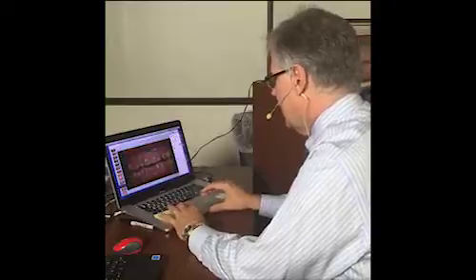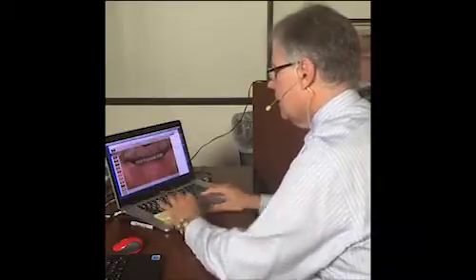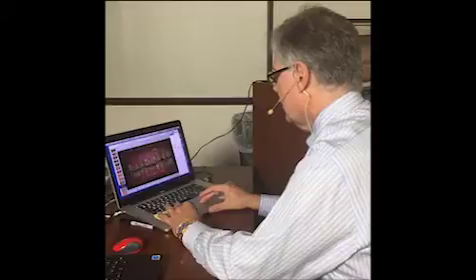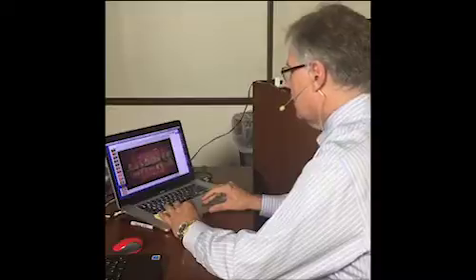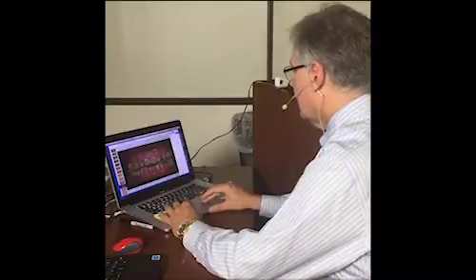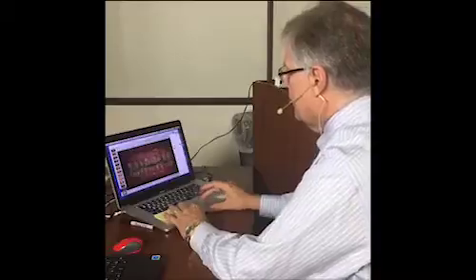Let's see where front teeth should be. So I am actually going to correct this image without, although I have my line, don't I? Let me go back to my line. Let's correct that image and come back to this. I'll put it in here. And to correct this image, I need to go to the canine. So I'll go a little bit kind of between where I think that is. Click on that. Hit arrange, and now what I can do is I can come right here, and actually that's going to be pretty close. Actually, I'm going to go one more. Okay? I'll usually leave my work, so I'll just duplicate the slide, and then I'll get rid of this.